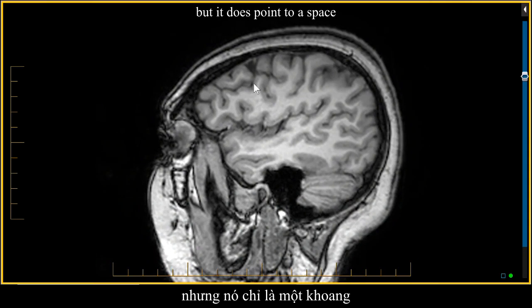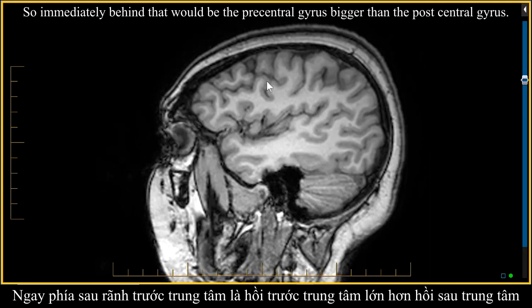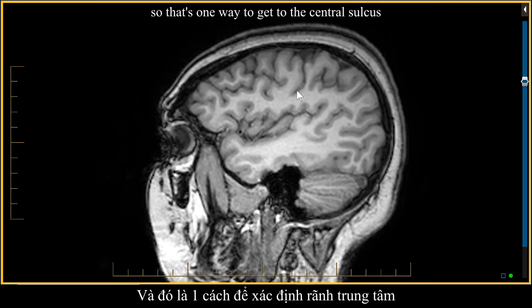But it does point to a space, and then that space gives rise to a sulcus, the precentral sulcus. For right now, pay no attention to this horizontal sulcus right here. So immediately behind that would be the precentral gyrus, bigger than the postcentral gyrus, and now you have your central sulcus of Rolando. So that's one way to get to the central sulcus.